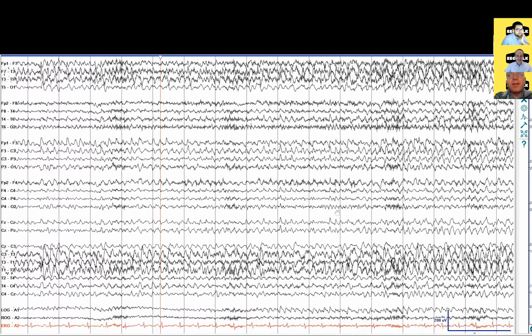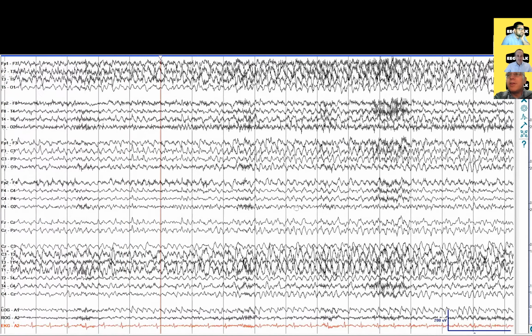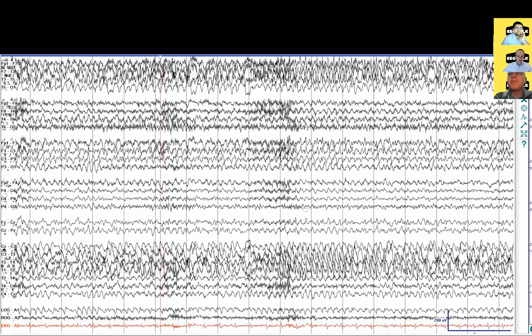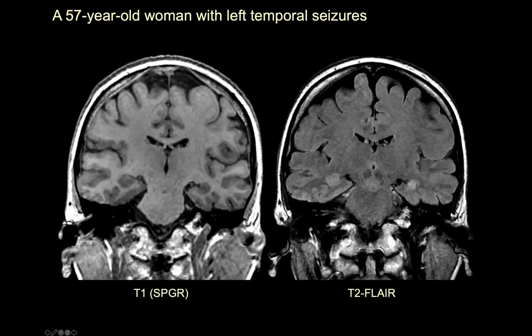Yeah, I'd like it if there was a nice correlation between the imaging and the EEG before we propose taking out the left temporal lobe. But I think Dr. Klein is pretty good at seeing subtle findings. So I say we give it a look together with him. Let's do it. I already labeled it. Yeah, while you were looking at the EEG, I got it all done.